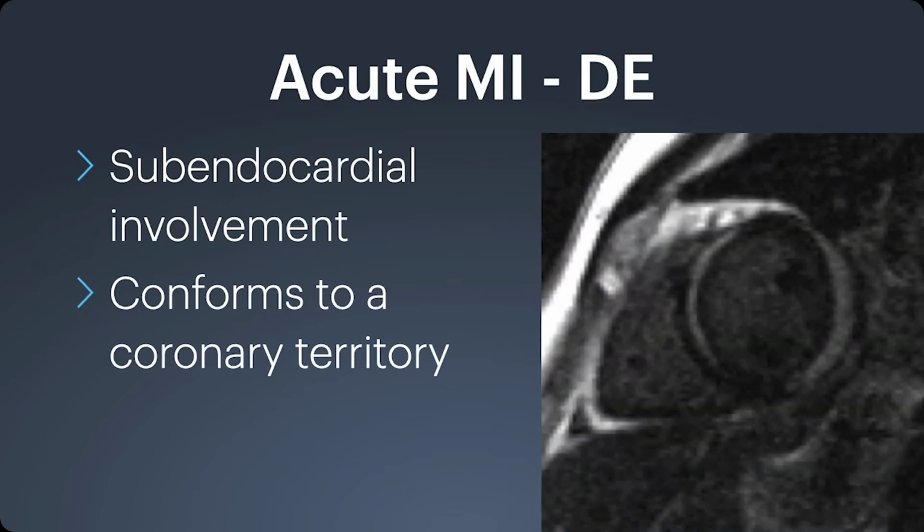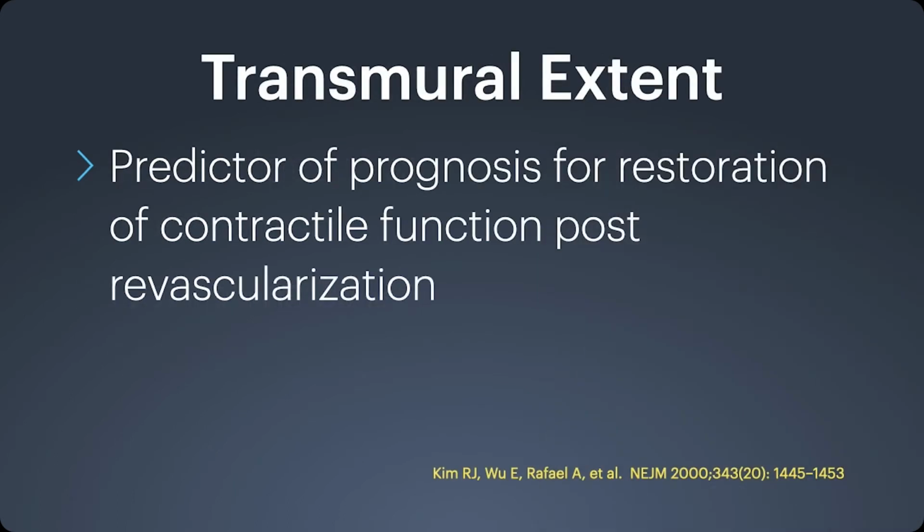Now contrast that with this example. We have abnormal delayed enhancement, but the subendocardium is actually not involved. Here it's primarily a mesocardial pattern throughout the septum, as well as portions of the lateral and infralateral walls. So this is not an ischemic pattern of delayed enhancement. This was a case of myocarditis.